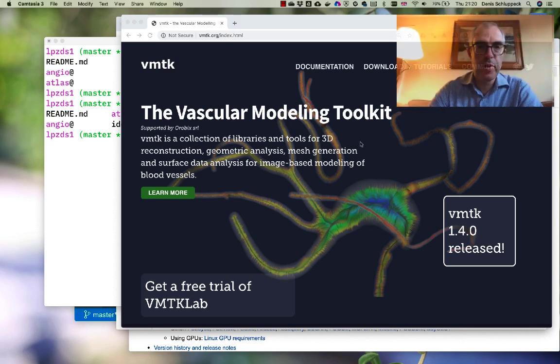Hi, so this will be a quick video on some visualization and also brainstorming about what we can actually do with this data set that we've collected before the COVID-19 hit. We have a couple of images that were acquired in a very similar way, so we can do some comparisons there. I've already had some interesting ideas about how we could compare this sample data set from a healthy participant with some atlas measurements which were published in this paper.